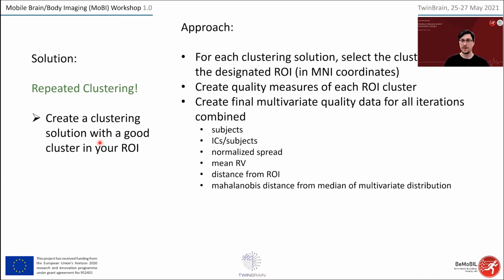But that's what this is for. We want to have a good solution. We don't want to tweak the statistics by adding ERPs in this case or something like that, but still we want to have solutions that are valuable for our study, right? We want to have many subjects. We want to have brainy ICs. We want to have close to our region of interest and so on. So that's why this should be there.